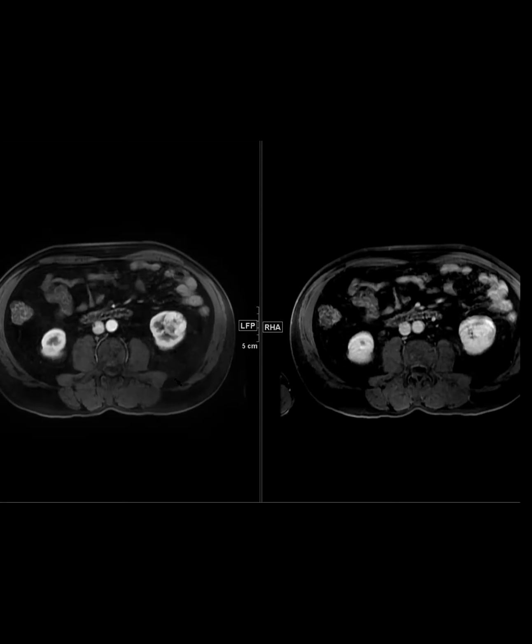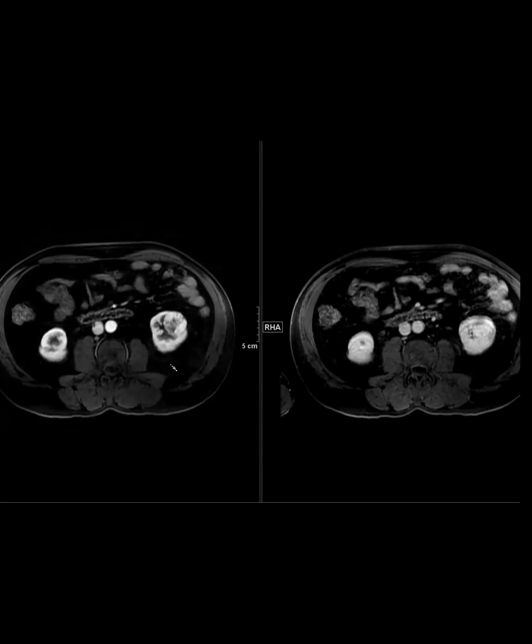Anyway, this is another oncocytoma, and it's just a cute one where it had segmental enhancement inversion, kind of. So this is the arterial phase, and this is the delayed. You can see there's avid enhancement along the periphery on the arterial phase that washes out later. And then the central hypoenhancing part gets more enhancing later. That's the feature called segmental enhancement inversion. It was initially thought to be a promising sign for oncocytoma, but now we know we can see it in chromophobe. But either way, when I see that now, I bring up this oncocytic neoplasm entity.